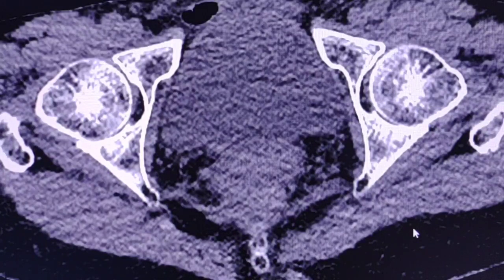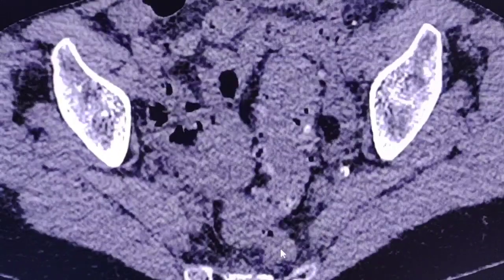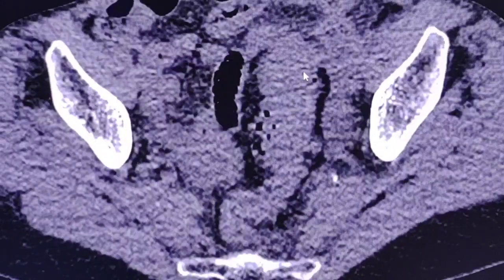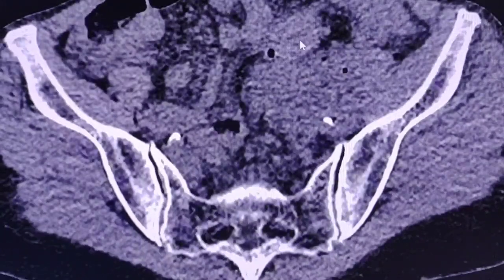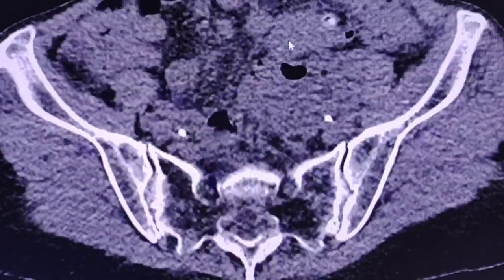as thoroughly as possible. So let's start from the anorectal region and let's track the large bowel first. Okay, here is the anorectal region. Just follow my arrow to help you. Here is the sigmoid colon. It goes up. Okay, here is the sigmoid colon.